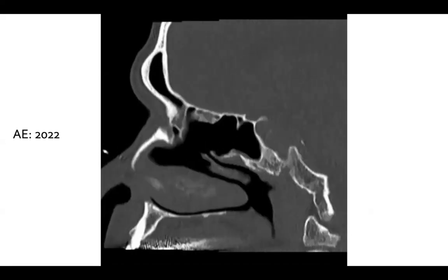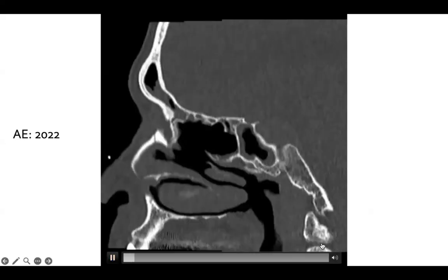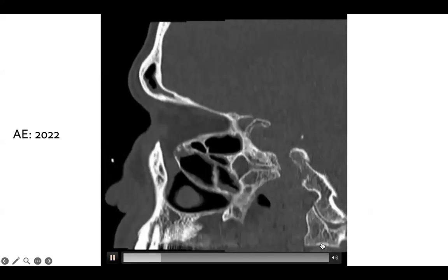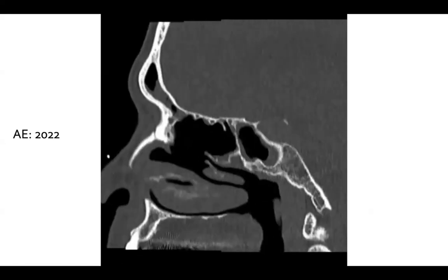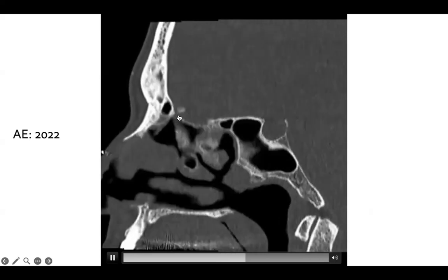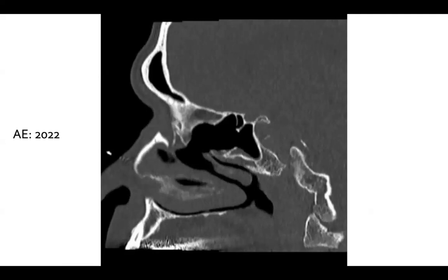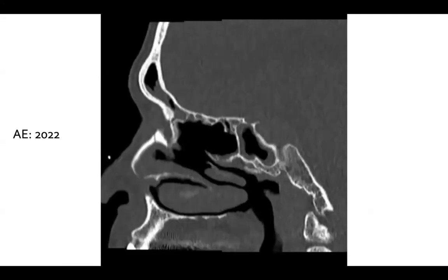Again, the right side looks great, but on the left side, you can see I wasn't a very good surgeon, because I left behind a couple of little shells that created inflammation, but I didn't rip out his mucous membrane. He's got a large, what you would call a beak, and so that needs to be dealt with.